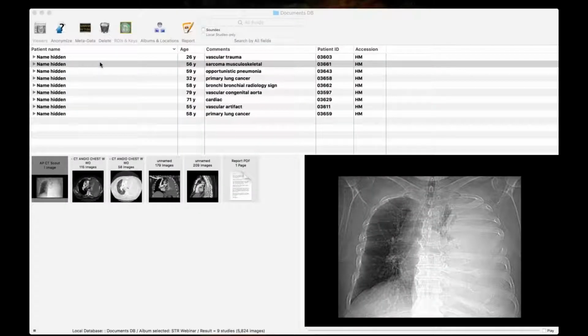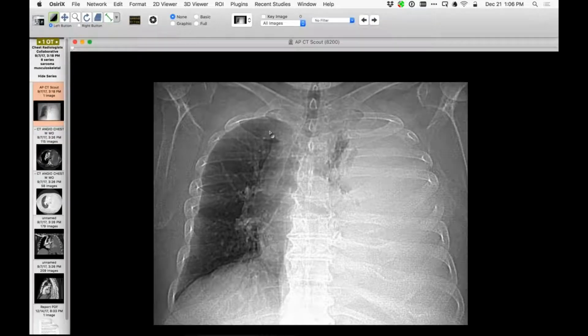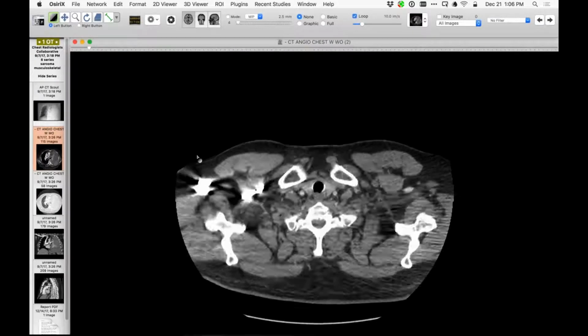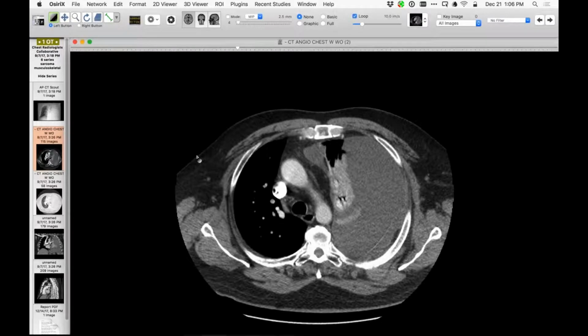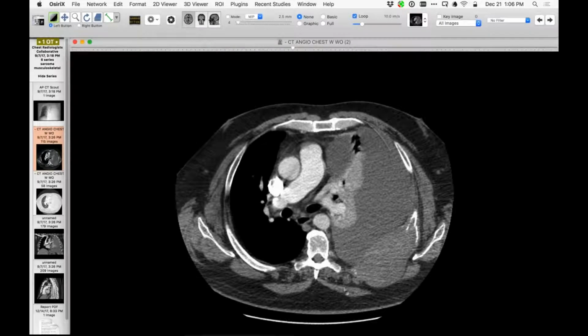All right, I'll start with this patient. This is a really unfortunate situation, as I'll show you. I don't have a chest radiograph, but it would look like this. I don't know whether at the time of initial presentation the chest looked like this, but at this time, going through the chest, we'll see a lot of pathology. There is a lot of fluid and atelectatic lung, and the primary lesion is down here.